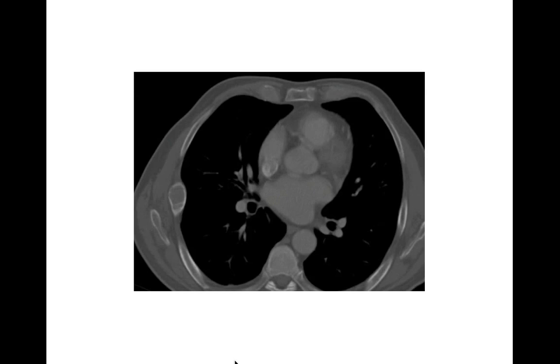An axial CT bone window shows an expansile rib lesion on the right here. It's geographic, it's a narrow zone of transition, it's lytic expansile. There's no fracture, there's no periosteal reaction. This could be lots of things. It looks fairly benign here. Benign expansile rib lesions certainly could be an aneurysmal bone cyst. Fibrous dysplasia likes to occur in the ribs. It could be fibrous dysplasia. That's a good thought for this.